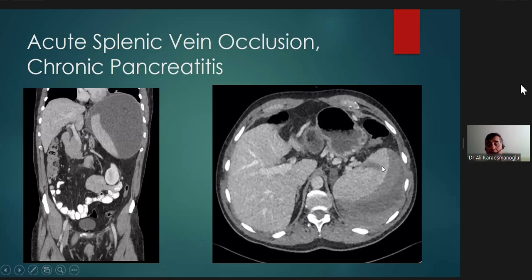On the axial plane image, you can see a small hypodense linear area. It's very similar to a laceration that we commonly see in trauma patients. And you see the layering here, right? In the posterior aspect of the subcapsular fluid area, there are hyperattenuating areas, and the rest is more hypoattenuating. And there's another slightly hyperattenuating area close to the spleen.